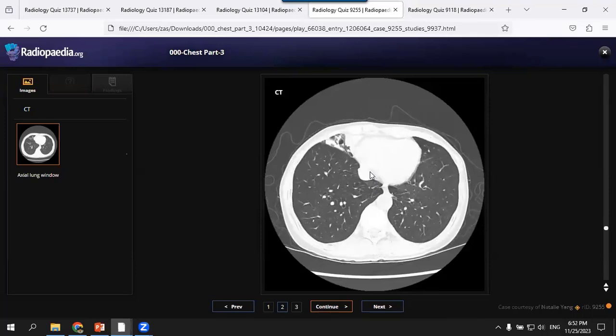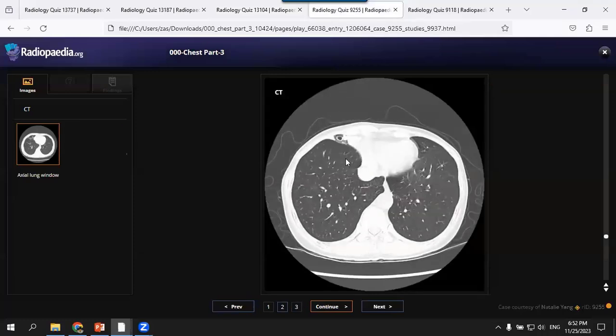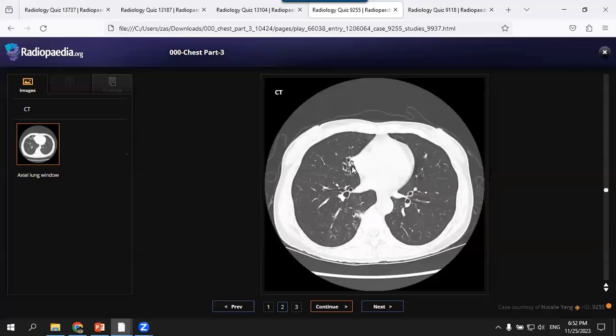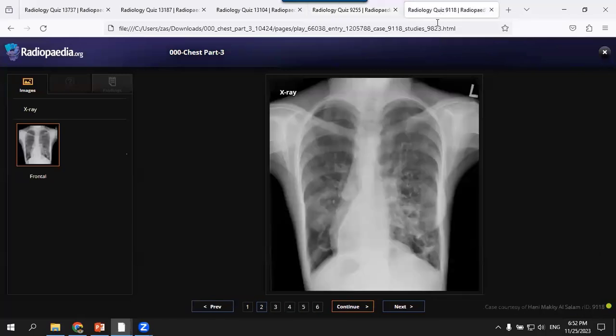or Lady Windermere syndrome. If the lower lobe is affected on one side or both sides, this is post-infectious. If the middle lobe or lingula, this is specific for Mycobacterium avium intracellulare or Lady Windermere. This is a localized type of bronchiectasis. Excellent. The last case is also easy for you.